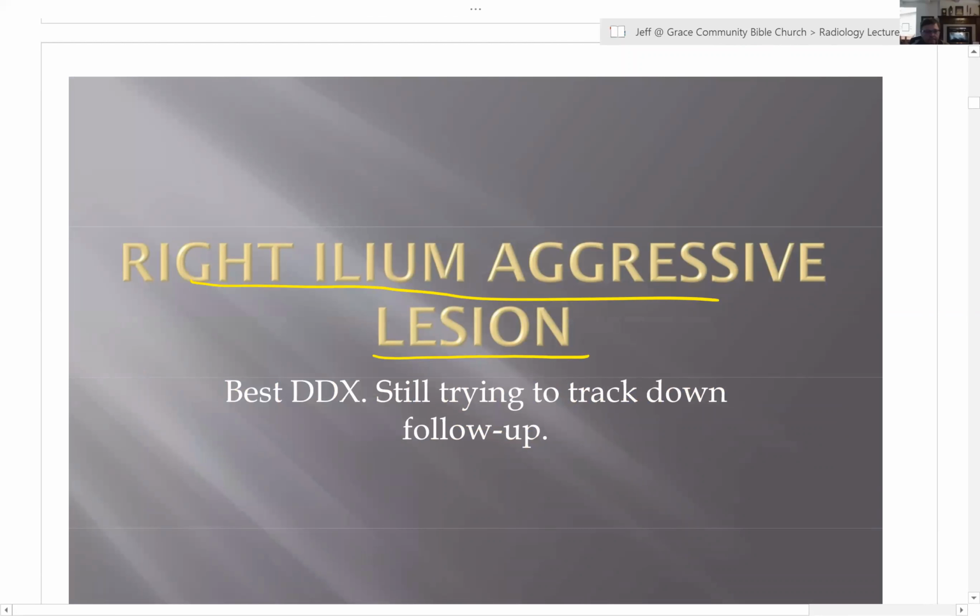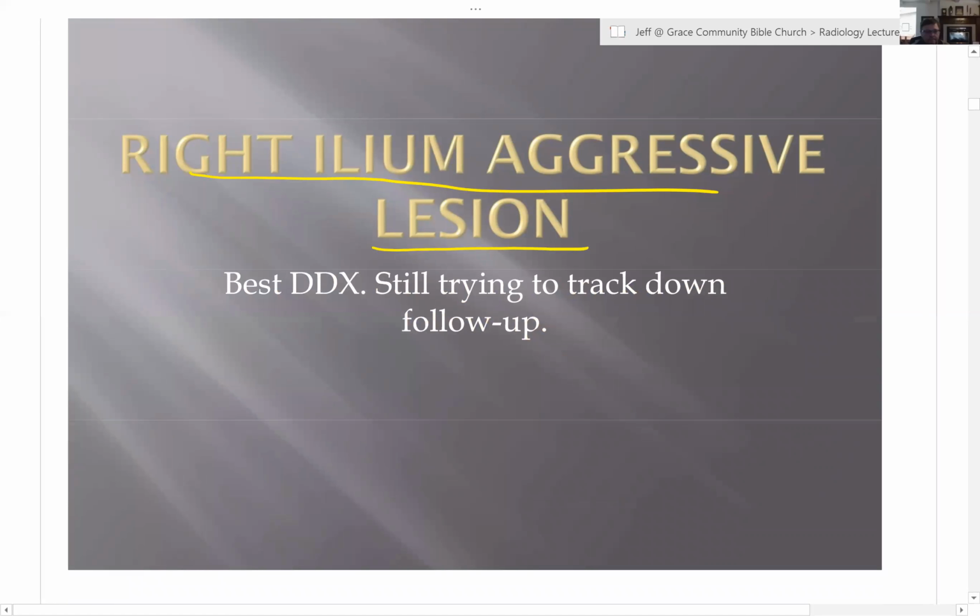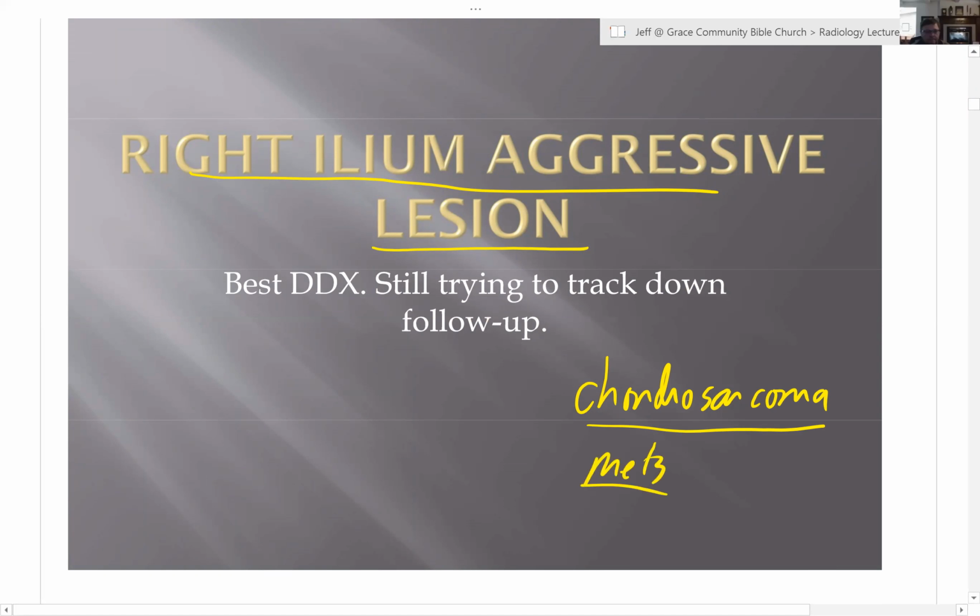But on MRI, the diagnosis was probable chondrosarcoma, number one because of the soft tissue mass and the bone destruction in a flat bone. But really, anytime we have an aggressive lesion, we still got to always put metastatic disease on there. Osteosarcoma doesn't work as well because that's going to be more in kids. But what I wanted you to hear is just to find it and to think whether it's aggressive versus non-aggressive.